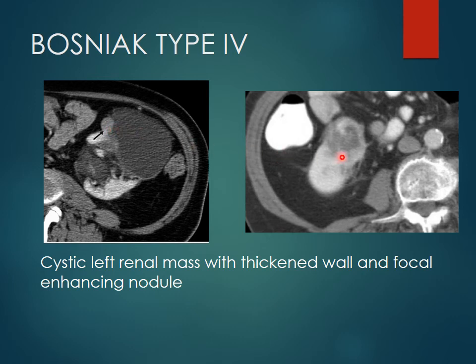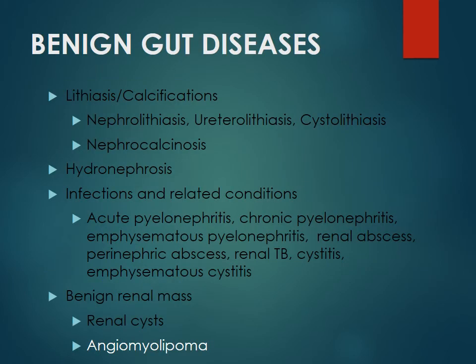In the image on the right side, we would be able to appreciate a mass at the right kidney with a heterogeneous enhancement in post-contrast studies. There's also no significant inflammatory changes that would suggest an infectious entity. And with this feature, we should have a high index of suspicion that this mass might be a malignant entity.